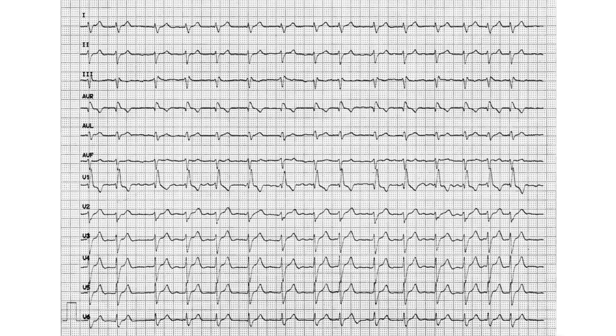Next, this is question 31. 3, 2, 1. Again, is it regular or irregular?